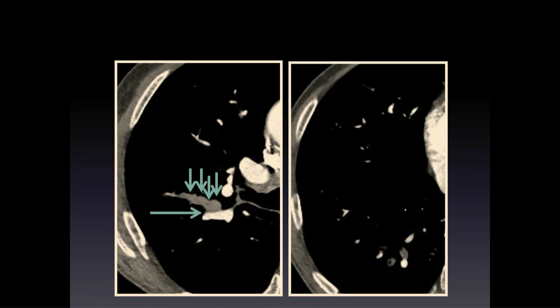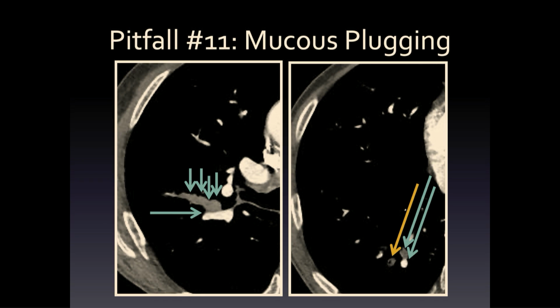If we had the whole case, we would even see, next to a contrast-enhanced vessel, a low-density structure nearby, right? And arteries don't run next to each other as pairs. So it's something that runs next to arteries, and we see even a branching one there. And this is something in the airways running next to the arteries, because they do run together.